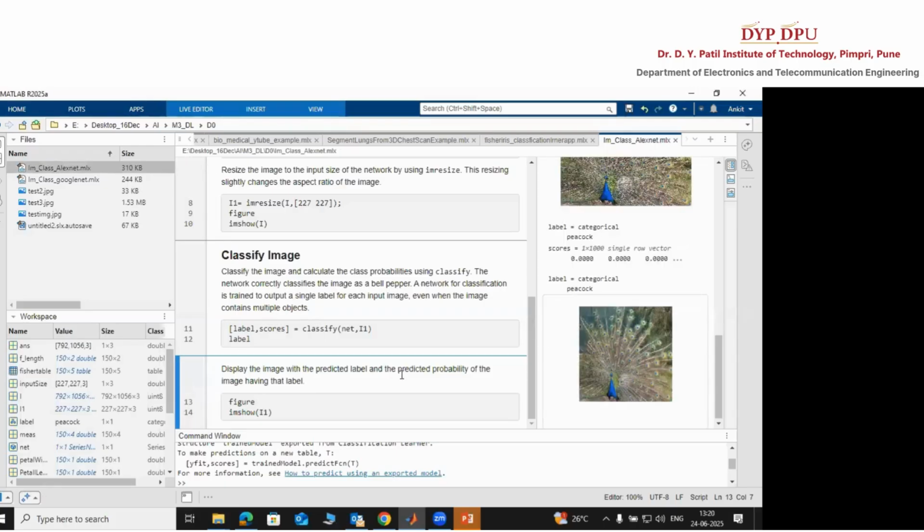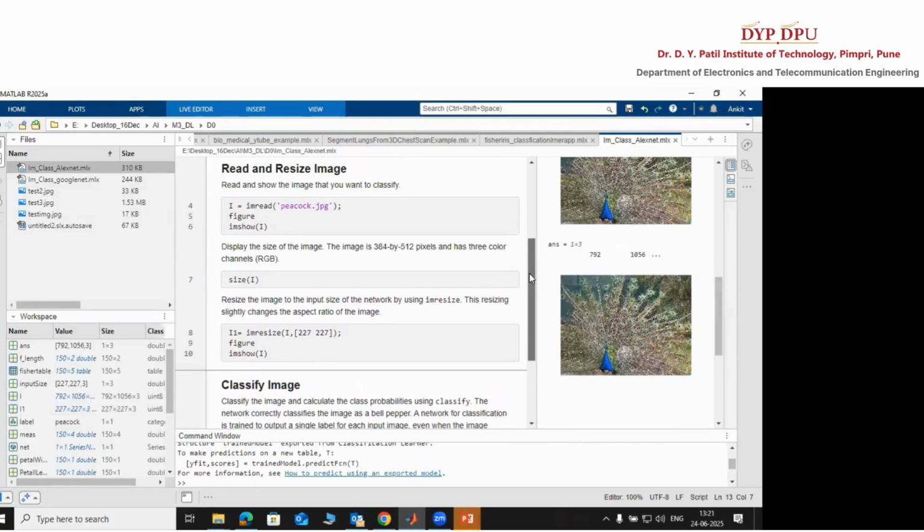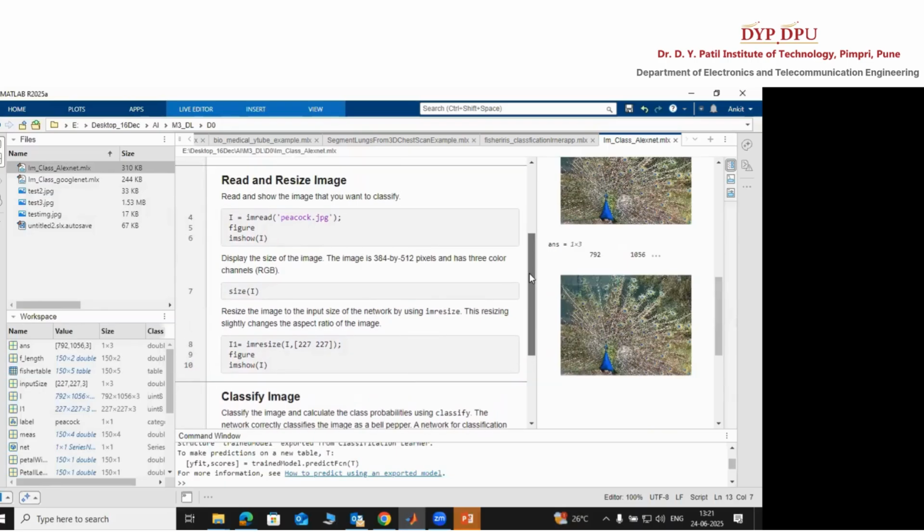Now you can choose the confidence. I have brought three images, and in my current folder they are there. What you can do is just change the value here and again the same process applies. In place of I, you can do this for your own images also.